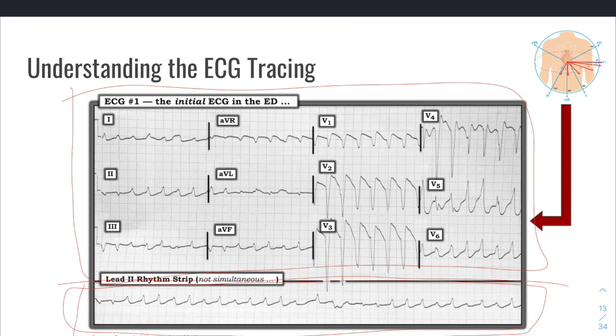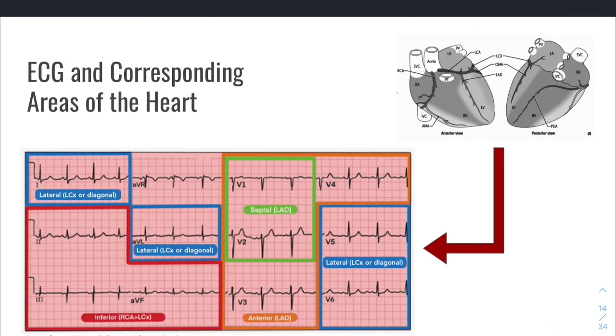And that's another segment of the ECG. So we'll get into it, but your rhythm strip is really good for determining rate and rhythm. And then you'll see a lot of classic signs of certain different pathologies in the upper half of your ECG based on what leads are being pointed out.